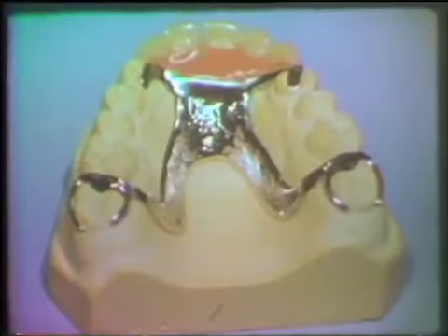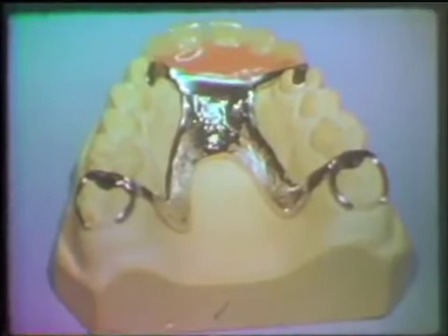The effectiveness of the rigid retentive component is dependent upon the conventional clasping utilized in the design. When the partial denture is in place, the rigid retainer remains passive since no flexible component exists.